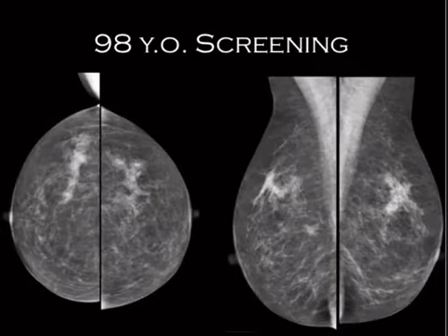So here we go, 98-year-old. This is a standard 98-year-old unit screener. Yes, women in the United States will continue to get screening mammograms for basically ever.